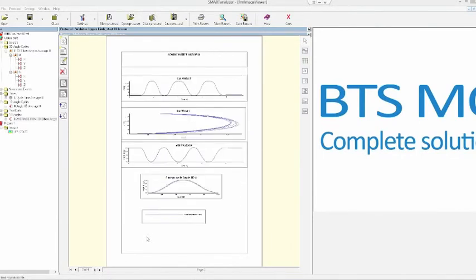Another option that I want to show you is this: we have created this page based on the test02 data, related to the data within these files. Imagine that we want to apply the same page layout to more than one trial.